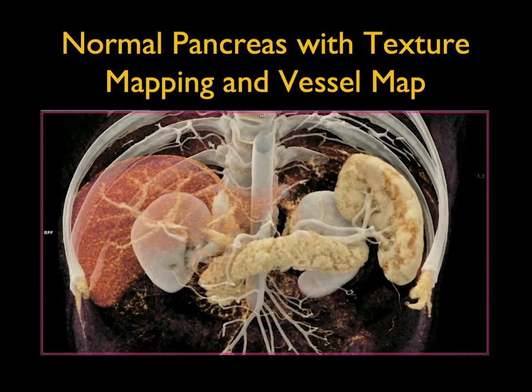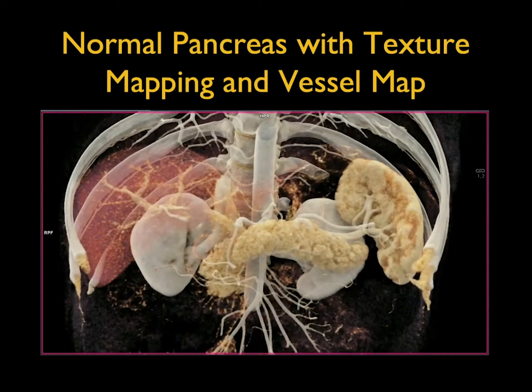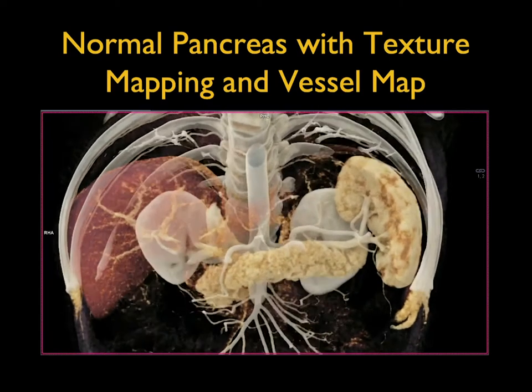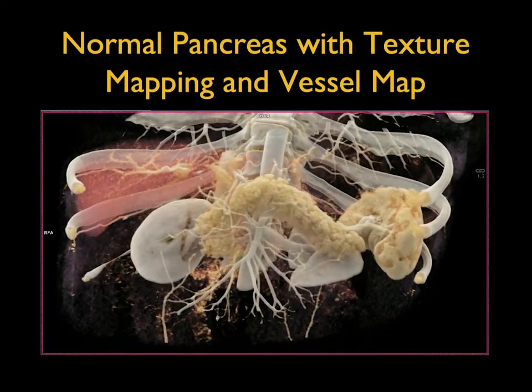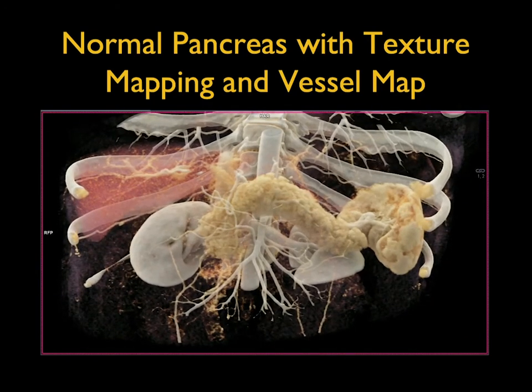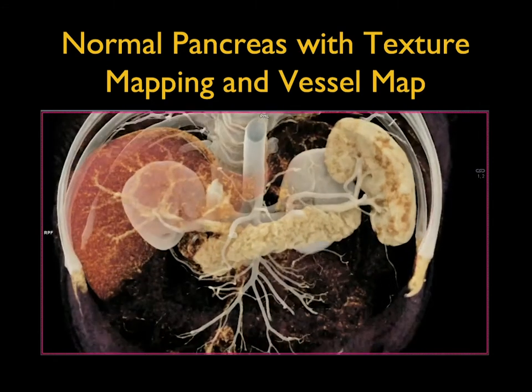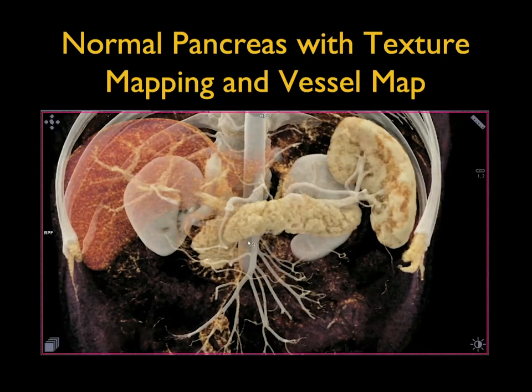And again, as we make transparencies, the ability to look at a volume and simply rotate through any planar perspective. In this case, I'm very nicely showing you the GDA as it comes over the pancreas and the relationship in this normal case, also showing you splenic artery and hepatic artery. Again, the visualizations of the organs, the visualization of the vessels, all of these changes are nicely seen as one goes through the various renderings. And again, this interactivity becomes very critical. We've always pushed for interactivity, and we've had it with volume rendering for a while, and we don't give that up when we do cinematic rendering.